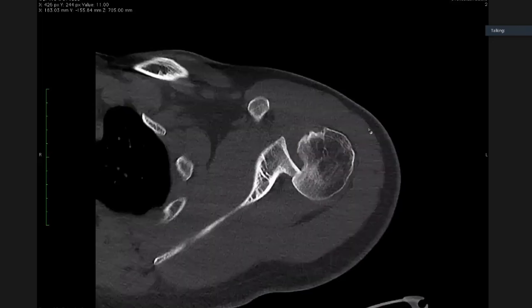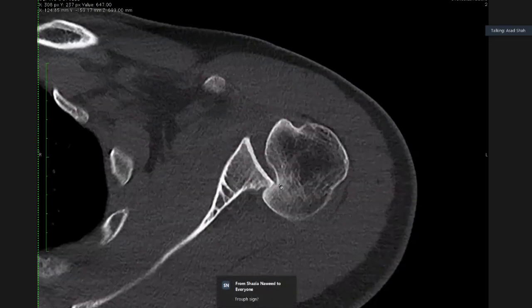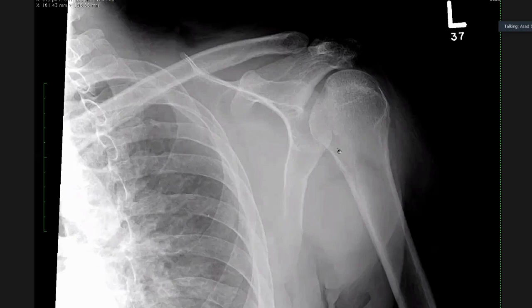So you see? That's what we were seeing, right? The humeral head has gone back and there's this big anterior Hill-Sachs, which we were seeing as an indentation. Okay, let me put the sagittal up for you. The sagittal is not that great here, but anyways, it's not typical.